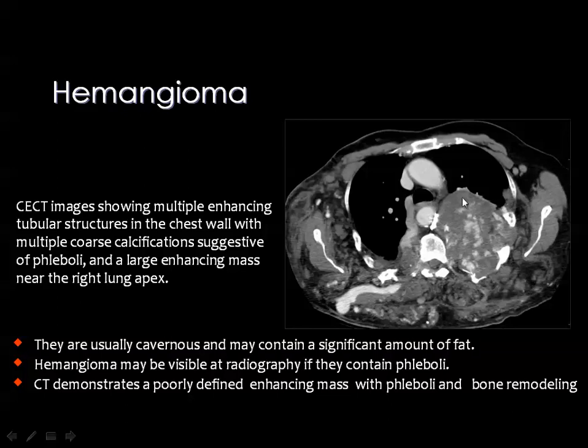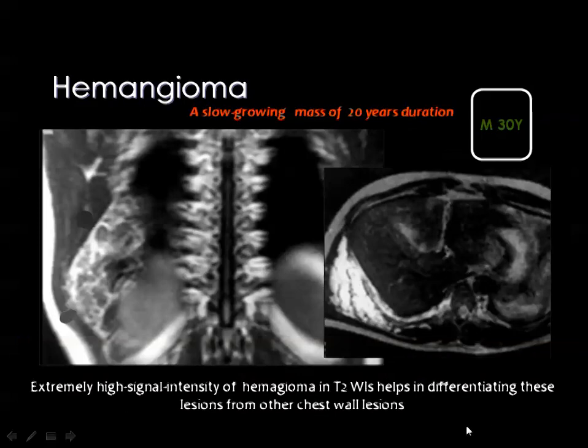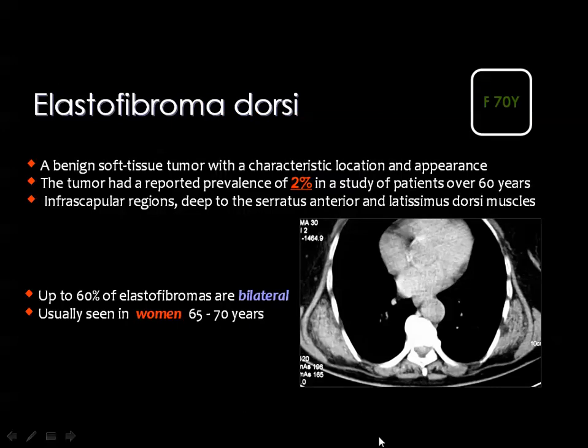And here you see a hypervascular lesion which has an intrathoracic component and a diffuse chest wall involvement. And you can see the pools of contrast inside the lesion, as well as the tortuous microvascularity involving the chest wall muscles, representing the hemangioma. And as I have said, the hemangioma on the T2 weighted image will show very bright signal, as you can see here, but on the MRI T1 weighted image, it will look of intermediate or even low signal intensity, and if you inject the contrast media, it will enhance significantly.